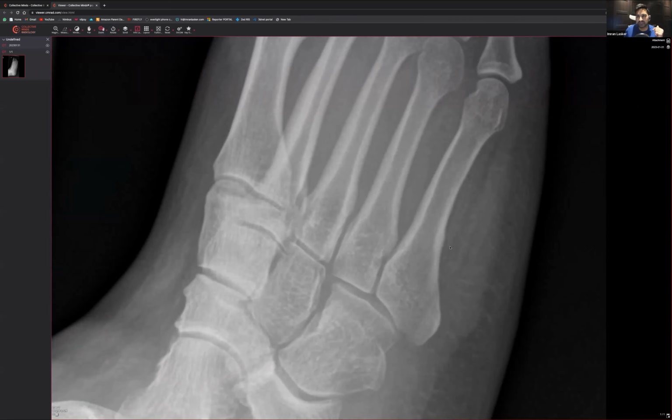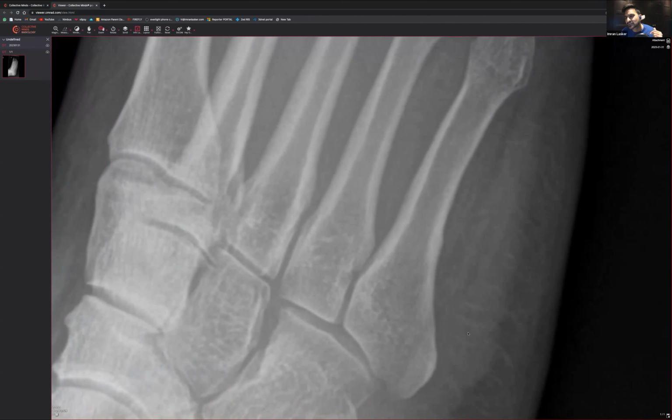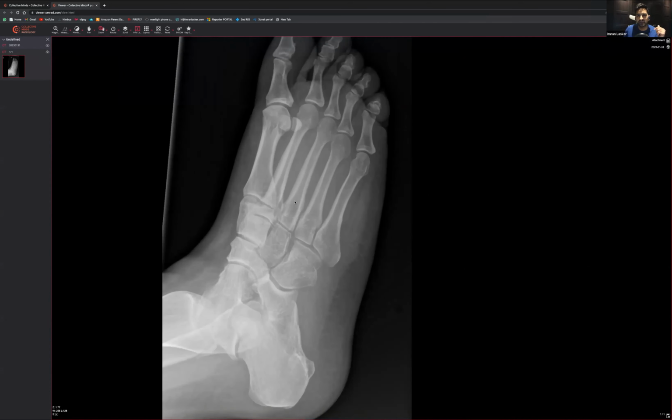If you zoom in a bit, maybe it's not projecting so well. I just wonder whether there's something going on, because that doesn't look quite right. That kind of fluffiness over there. So we'll come back to that. Just make sure there's nothing else going on anywhere else.